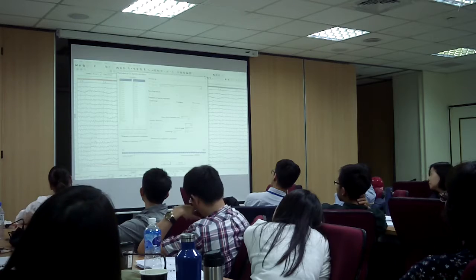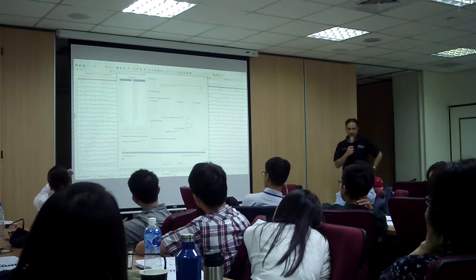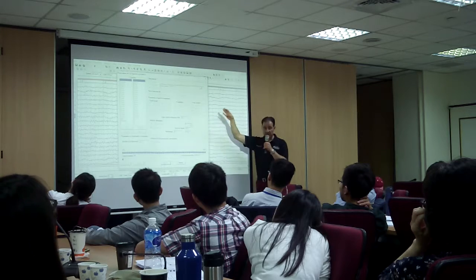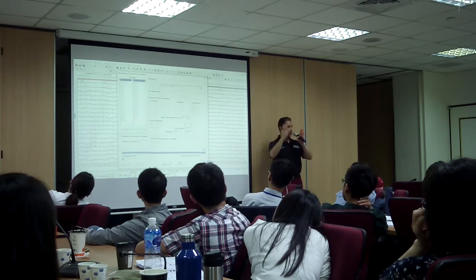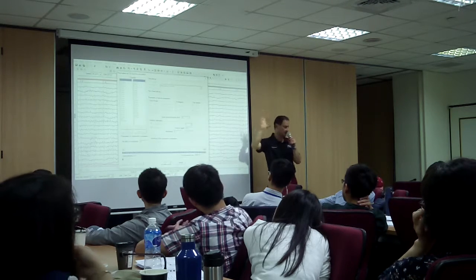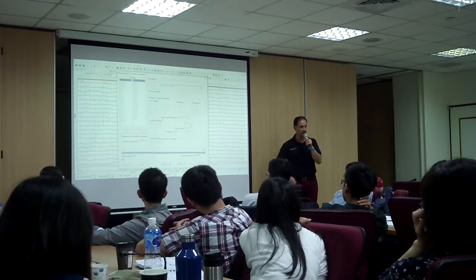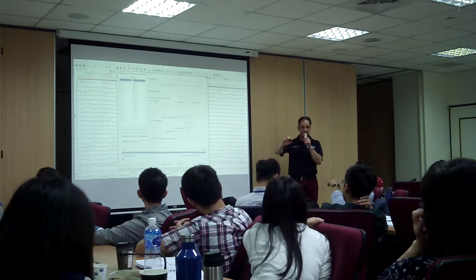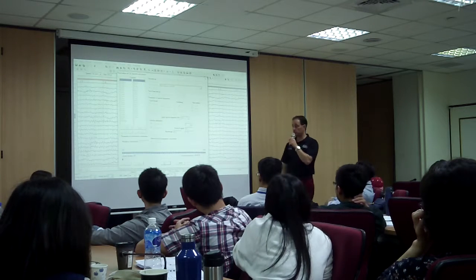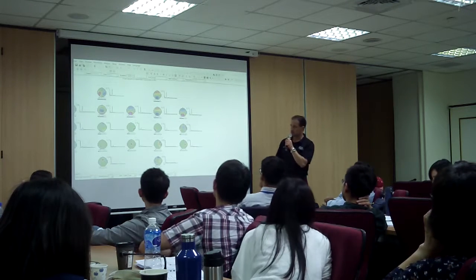So what this is going to do is break it down into independent components that are significant and relevant. The 10 minutes that we have recorded of eyes open are 100% of the EEG. What this is going to do is break it down into different topographies, in different colored maps. And instead of having the frequency below, they're going to have a percentage. And what that is going to show is what percentage of the problem that is.